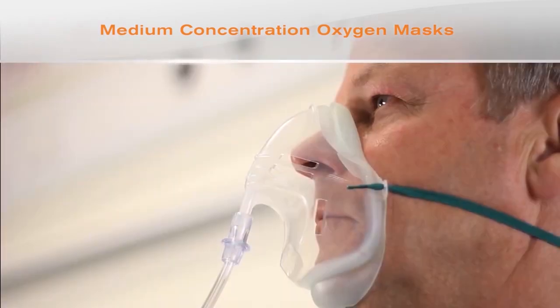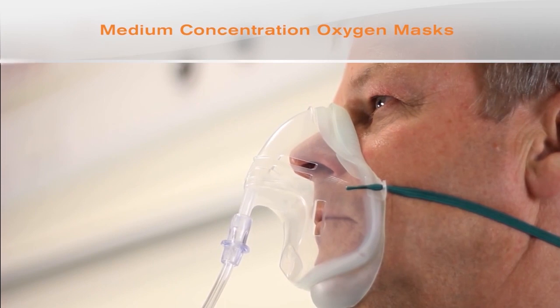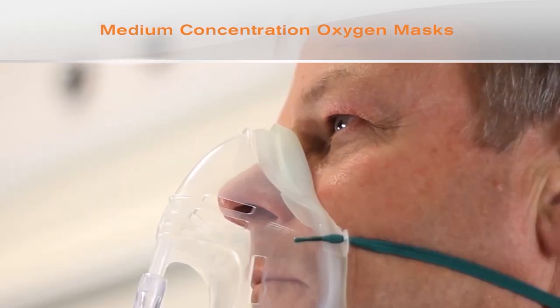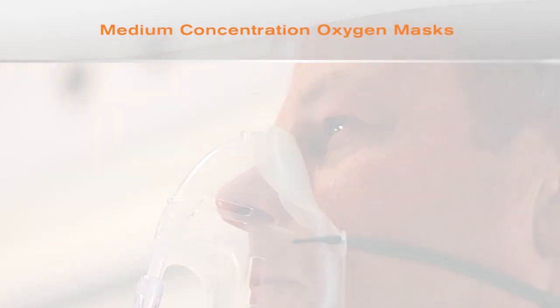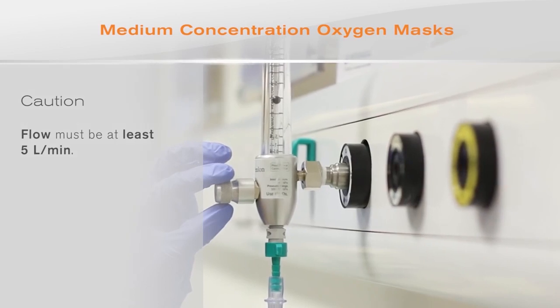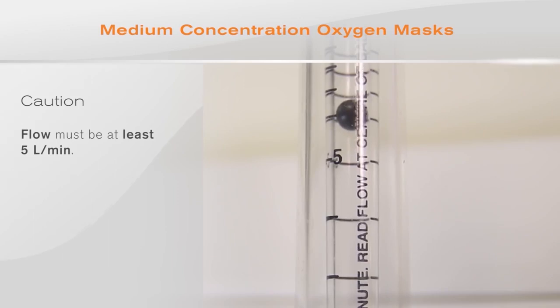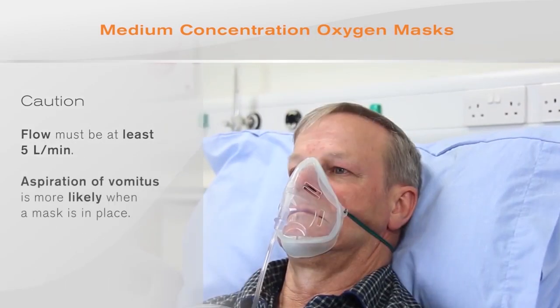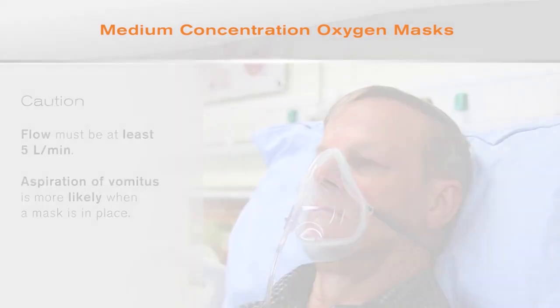It is important to use a mask which obtains a good seal on the patient's nose to prevent oxygen entering the eyes. A poorly fitting mask can expose the eye to a high flow of dry oxygen, which can result in exposure keratopathy, which then may lead to corneal perforation. Caution must be taken when using these masks to ensure that the flow is at least 5 litres per minute to wash carbon dioxide out of the mask and prevent rebreathing. Aspiration of vomitus is also more likely when a mask is in place.